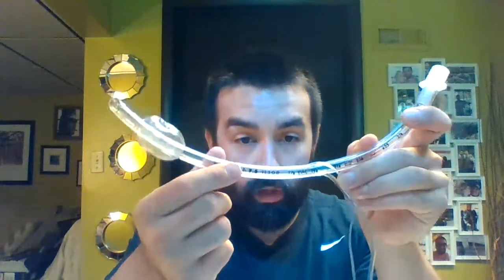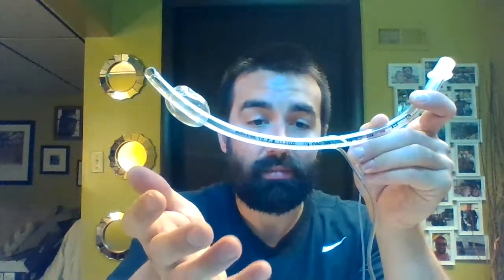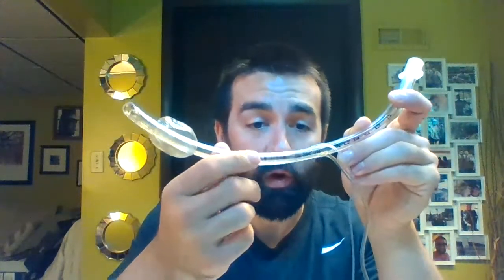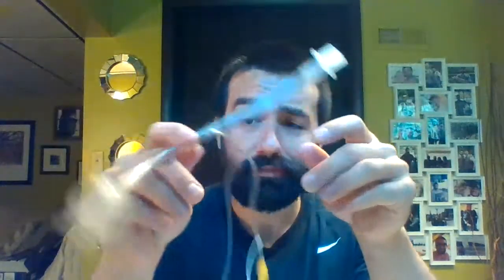It's important to know that we describe all of our ET tubes by the inner diameter, not the outer diameter. So ID 7.5, being able to read these. If you're opening a package, it's going to say what size it is, but sometimes it's important to be able to look at a tube and confirm, if EMS is bringing it in, or you're taking on a patient, or making sure somebody charted something right.